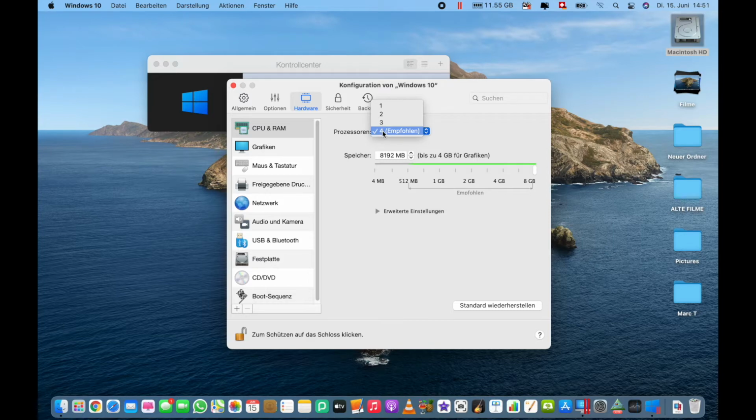And truly, we've tried to run the ActiveView High Speed on speed mode 3 using 2 processors. It will just get stuck and not continue to work. But on 4 processors, it will run really beautifully.